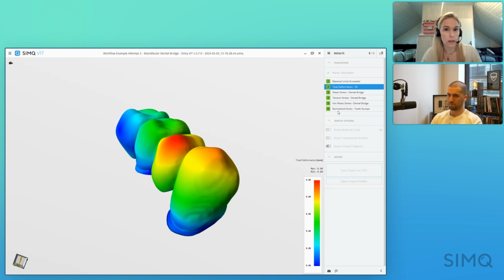Bone density and bone quality and individualized bone characteristics are always asked of us. So the thing is when you're doing a mandibular reconstruction, is the bone the same as that of a 21-year-old athlete male who maybe had an injury and it's a revision or something? And then what about the 82-year-old osteopenic or osteoporotic woman who has a cancerous mass removed from a jaw? Two totally different scenarios. So the bone density that is accounted for in VIT is a normal, healthy bone.